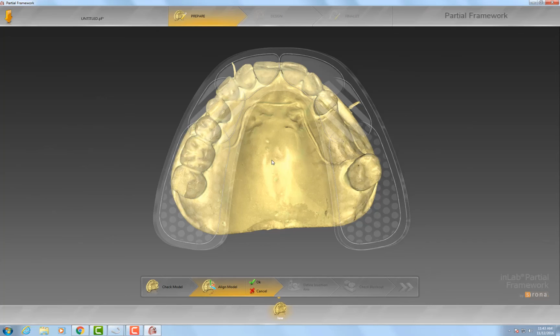It's not blocking out a model, then duping it, then going to design. It's taking it backwards. Anytime you take it backwards, you cut 2 or 3 steps, and you get a lot faster. Speed and efficiency is what will make you the money. Literally. So again, same blockouts, same everything. You hit OK, check your blockout.